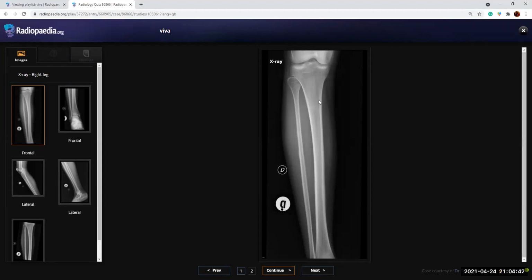You can leave that. Yeah, so I think... you can leave that. Sorry? You can leave that. You don't bother about that. Okay, sorry. Pathology is something else. Okay, so I'll go to see other images also? Or you actually want it to be more evident in this?